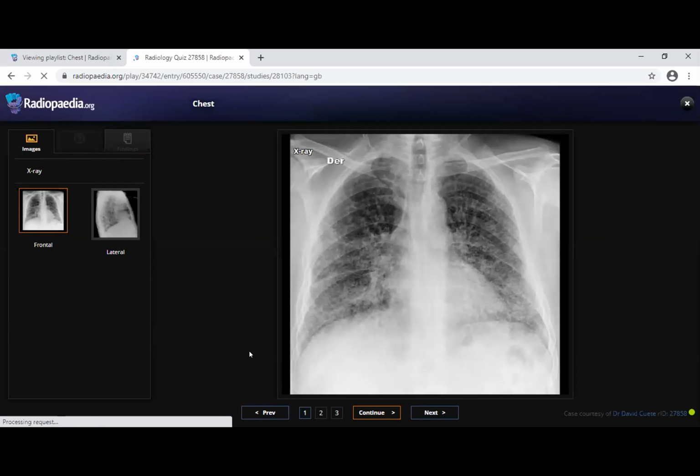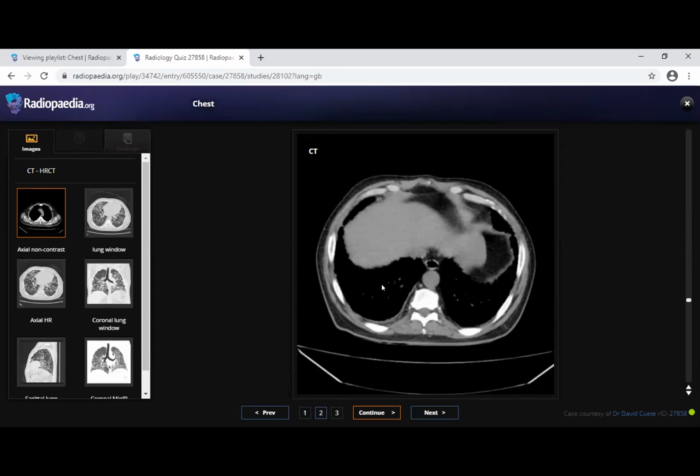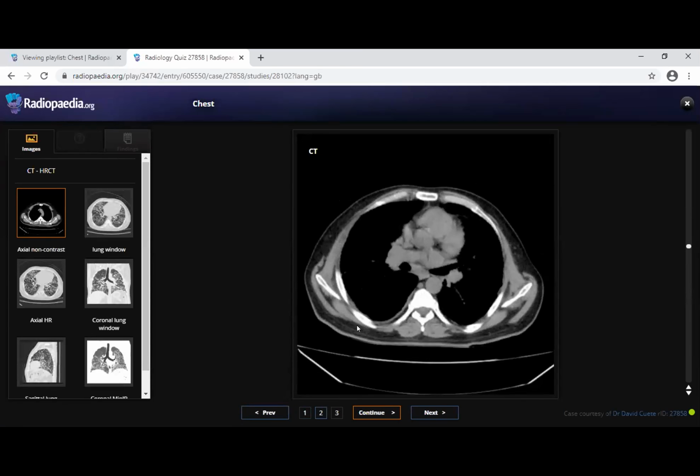This is a case of ILD. You told about the esophageal dilatation. I don't think there was a significant esophageal dilatation in this. Anyway, the finding was a typical UIP case. Okay, idiopathic.